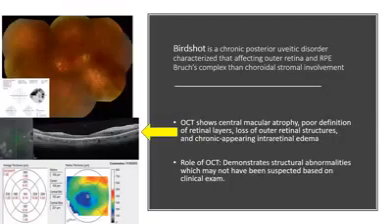The other advantage of the OCT is that it can sometimes identify atrophic changes at the macula because of chronic posterior uveitis. If you look at the color fundus image, this is a patient with birdshot retinopathy complaining of a drop of vision in his right eye.